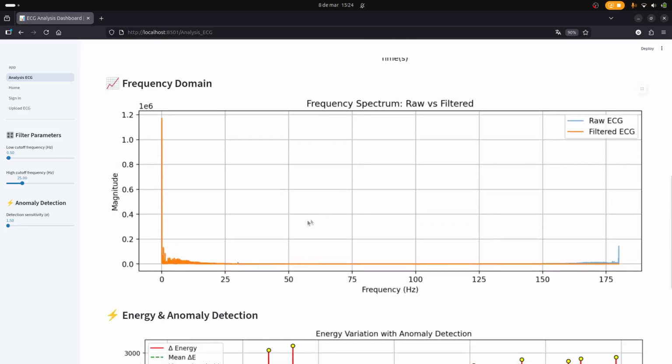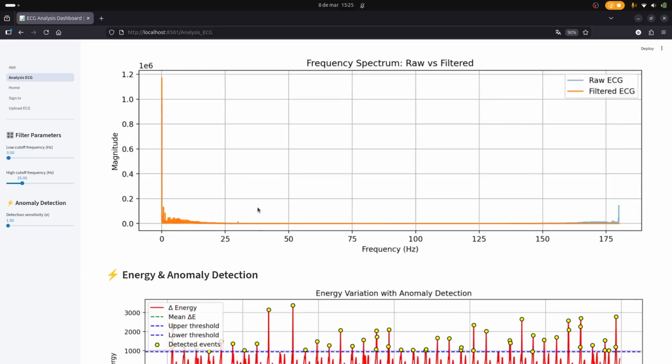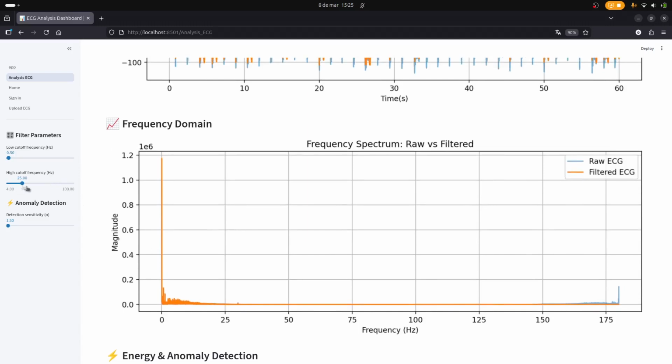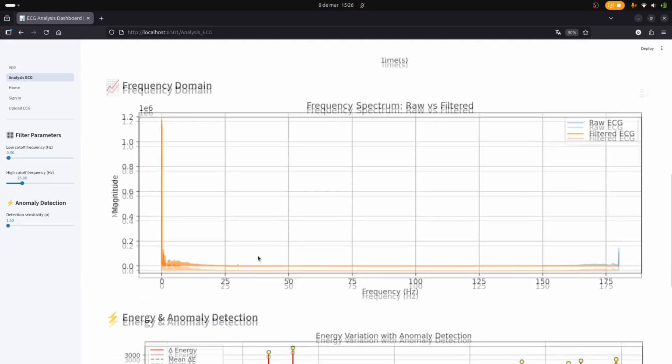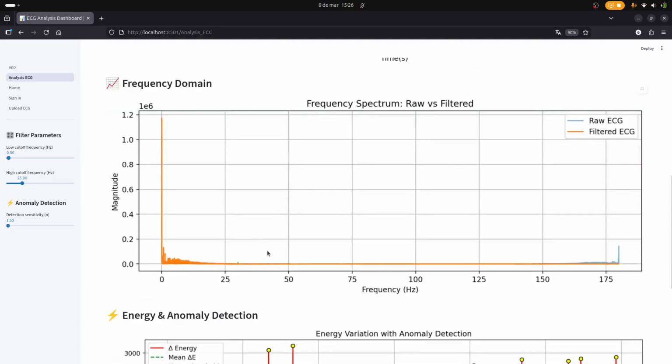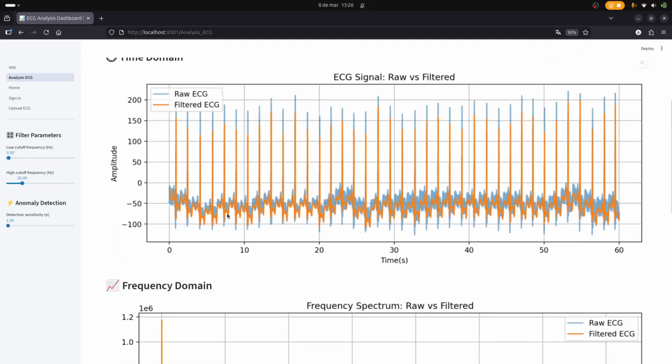Note one thing after all of the building of this digital signal analysis: if I hadn't implemented the filter, our analysis of anomalies in the patient's ECG signal might be completely compromised. So pay attention and take care modifying these two hyperparameters, because they are directly associated with the building of our bandpass filter, and consequently the way that we can get the interesting frequency range to be used in our analysis.